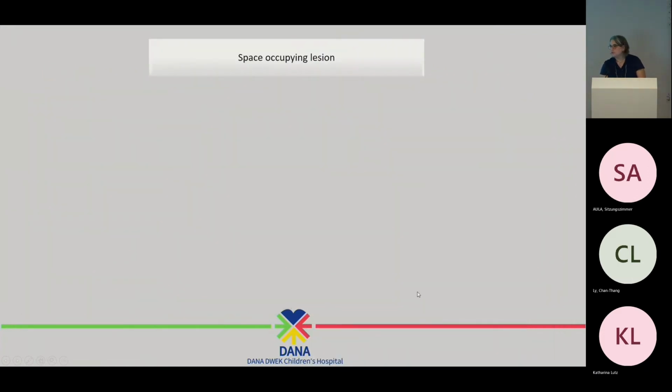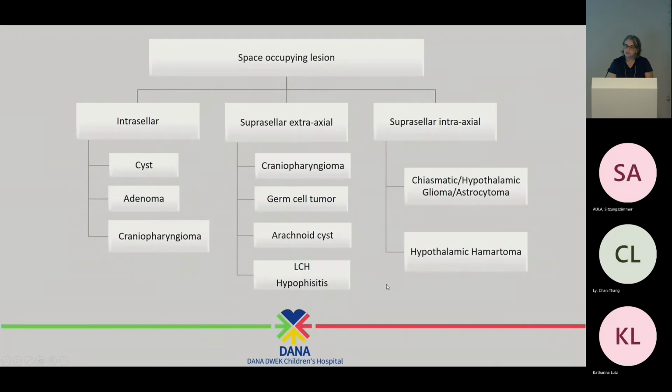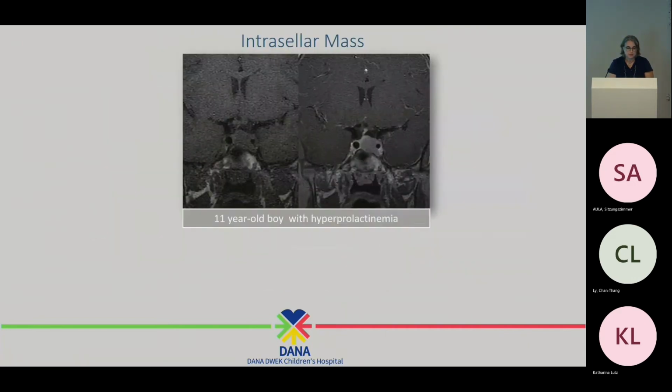As we move to space-occupying lesions, as was mentioned before, we look at the location and the anatomy, and then try to give the differential diagnosis related to that. As you will see, the larger the lesion, the more difficult it is to pinpoint the origin.